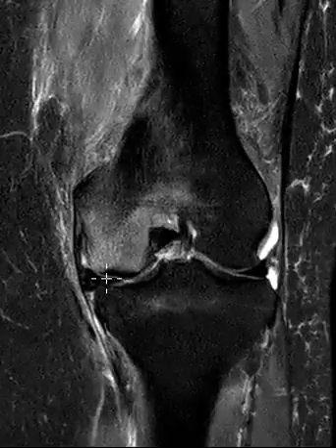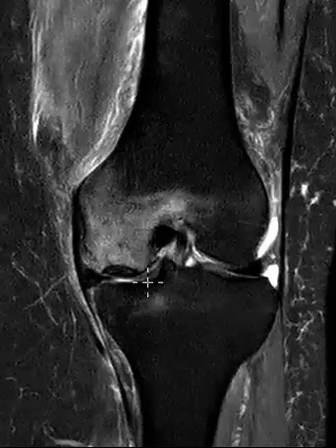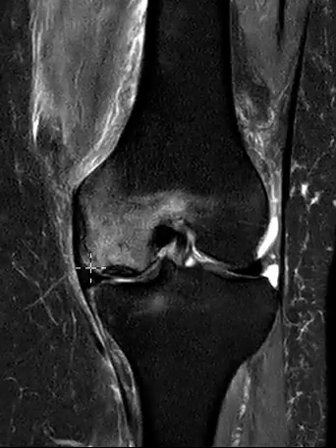This is partially torn, maybe some stuff hanging on a little bit, but the meniscus looks like it's squirted out just a little bit and not doing its job. So again, this is a tear of the meniscus. The meniscus is not doing its job, causing abnormal mechanics of stress.